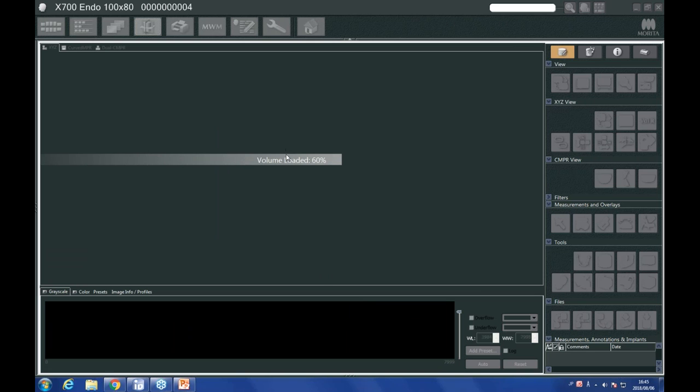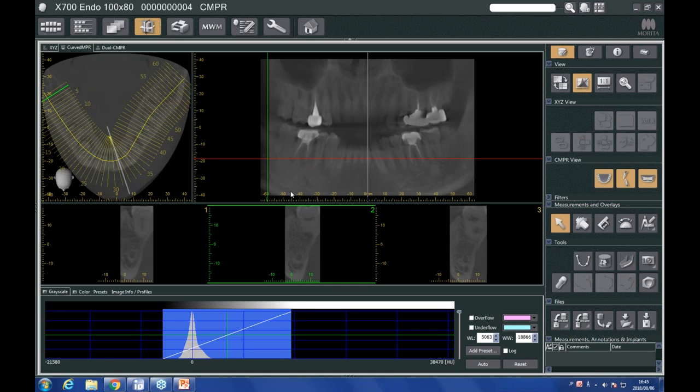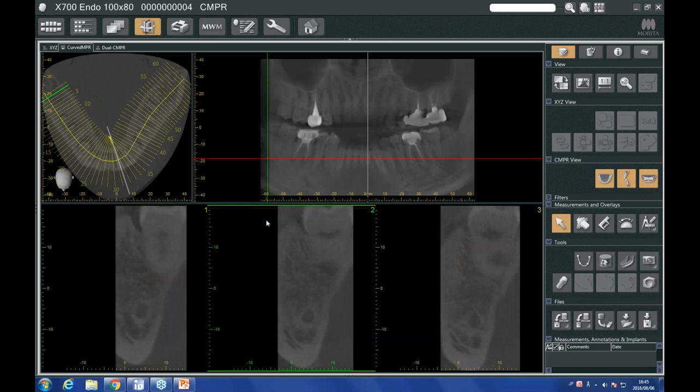So anytime I'm looking at this patient or this data, I'm going to select one of these saved states. Most commonly, I will choose the one where my contrast is adjusted. Now this might look a little bit different. The main reason it looks different, of course, is my histogram is available. So I'm again going to hide that so that I can look at the same view that I had originally.